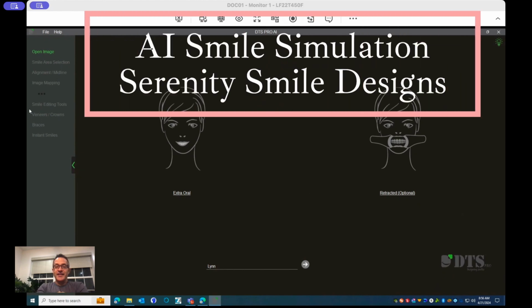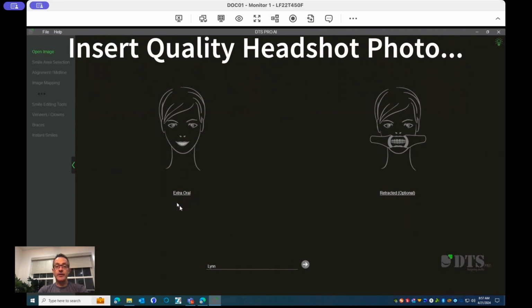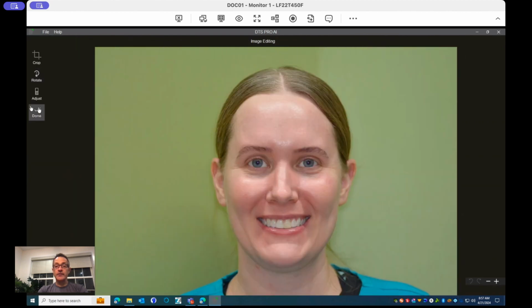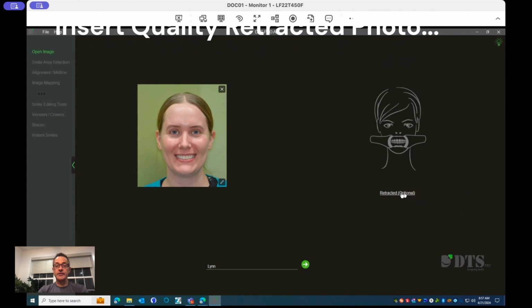Hi, I'm Dr. Erik, and I want to show you how I use this new AI smile simulation software that we got. And it's really revolutionized how I do my smile design. So first we're going to insert some quality photos that we have taken, and we're going to let the software do a smile simulation based off of the facial analysis and artificial intelligence.